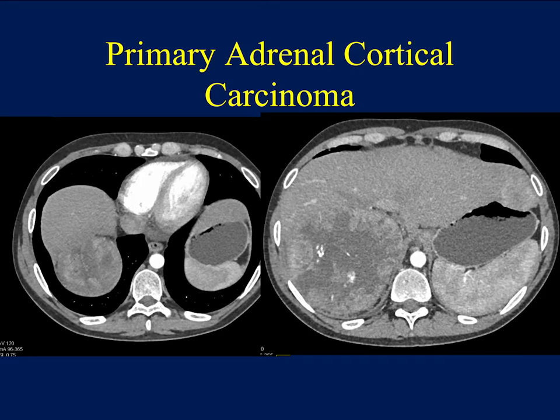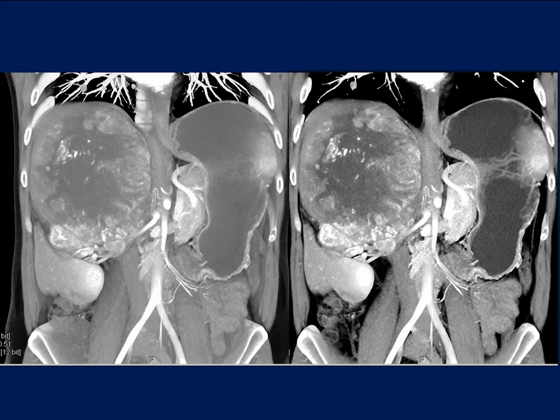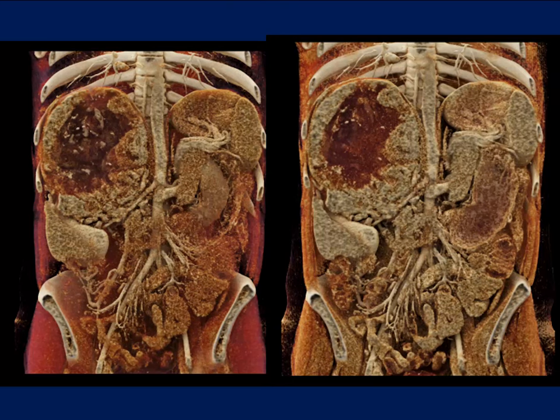Here's a larger lesion. Now here it's easy, right? Large lesion, lots of vascularity, lots of necrosis, dystrophic calcification. Okay, it's hard to get past anything else here. There are these rare sarcomas of the adrenal. I guess you could throw those in if you wanted to be desperate. You see one of those every couple of years. But this is your aggressive ACC. There's vascular involvement. There's local spread. Patients will do poorly. You can see on the cinematic the really extensive necrosis of the tumor.